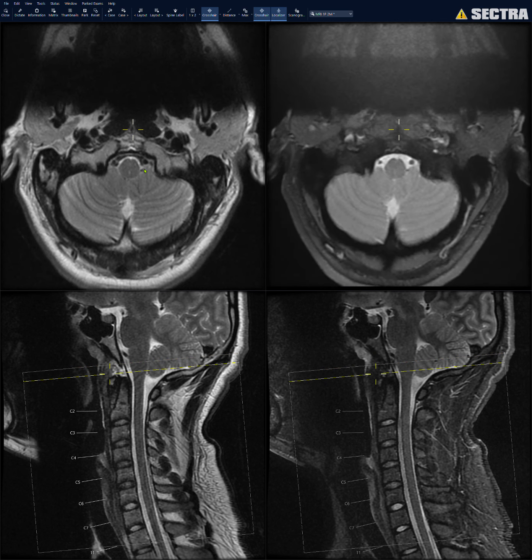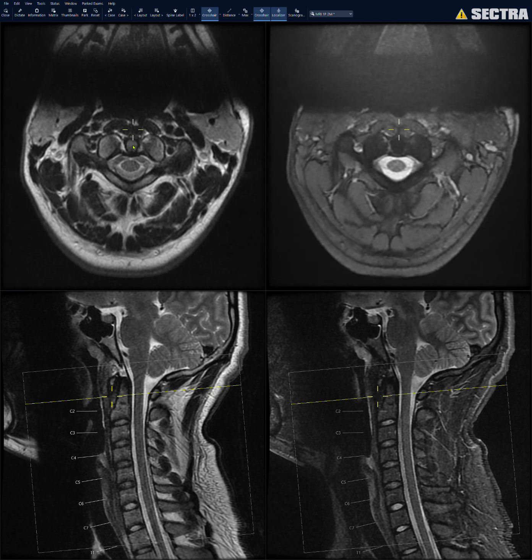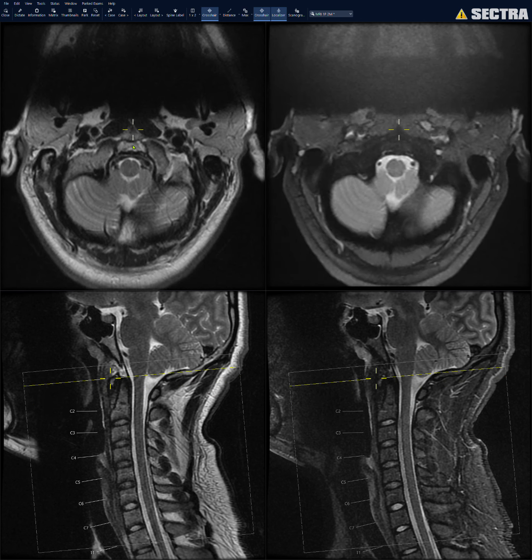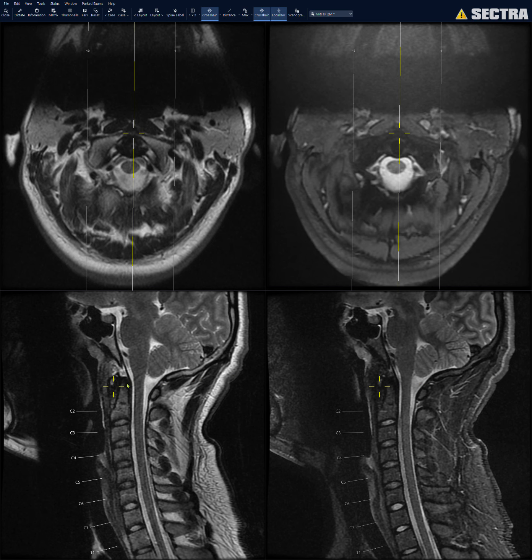All right, so I look at each and every level. I look for spinal canal and I look for neuroforaminal stenosis. So here, level C1, usually there's not too much going on there. Sometimes you can have degenerative changes of the median atlantodental joint and some retrodental soft tissue thickening. And so you can mention that if it is there.